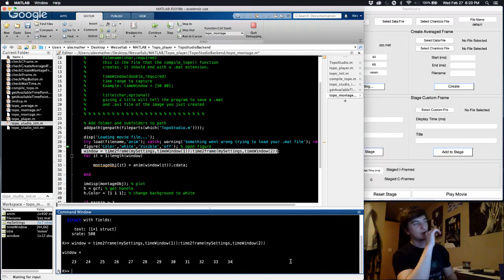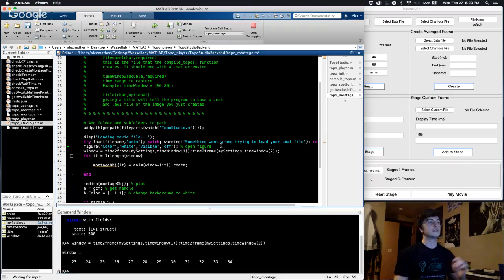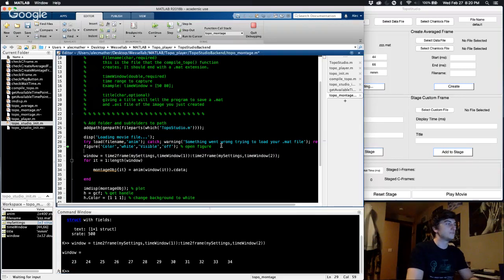So actually what we need to do first is figure out if what they're asking us is available to them. We have 44 and 66, so we need to get our available points right here.